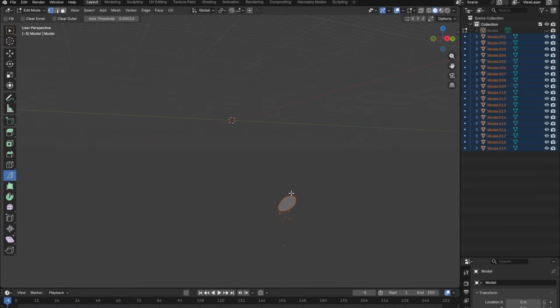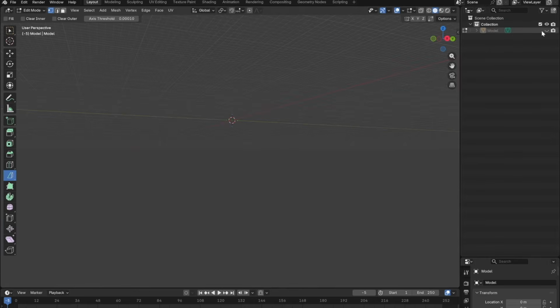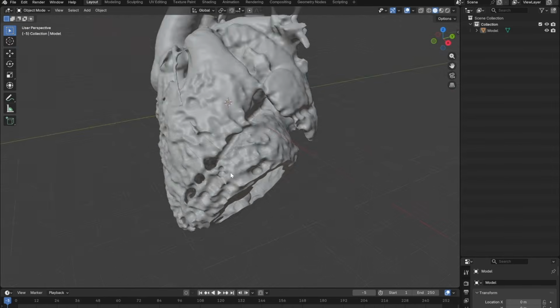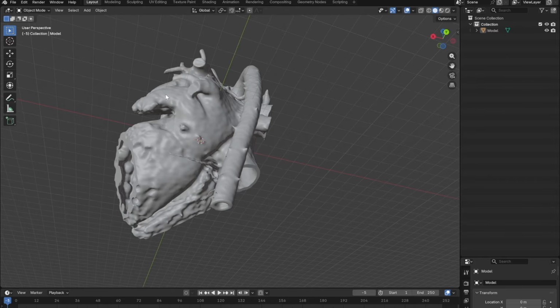We can unview the model, and then here we can see some small suspended parts. Once again, select the first one, press shift, select last one, which selects all of it, everything in between, right click and delete. So now let's go back to object mode again. We are only left with our model, which we now plan to print.